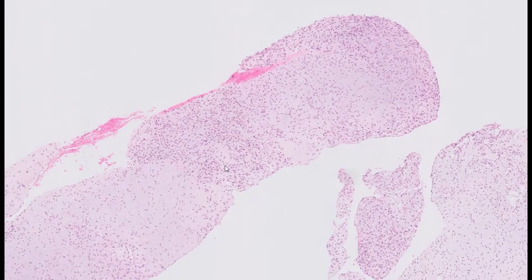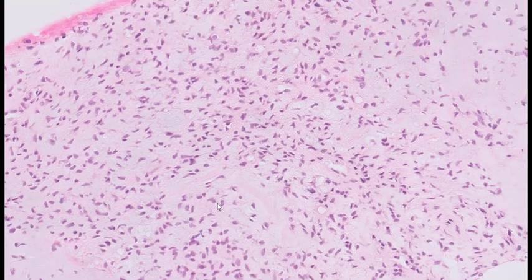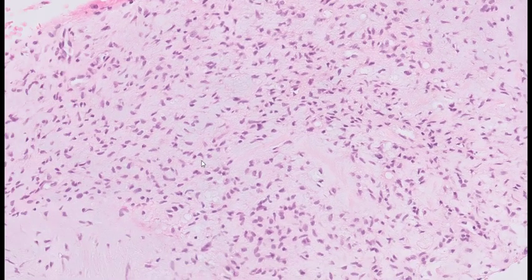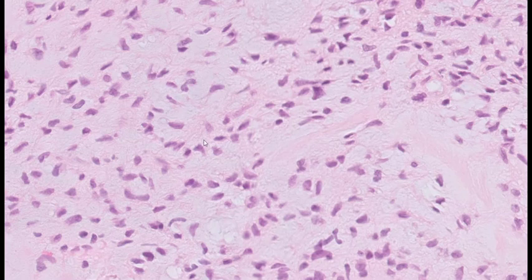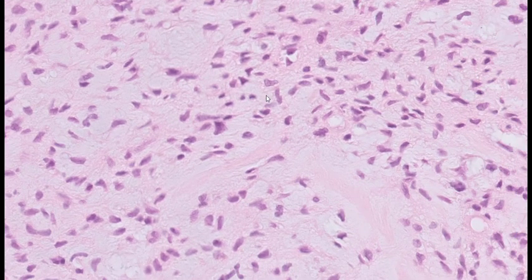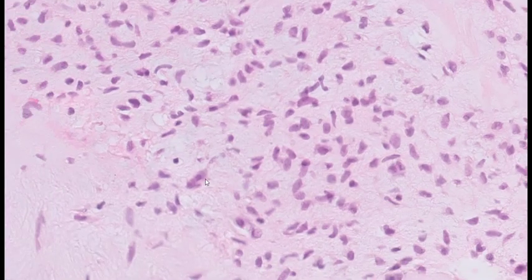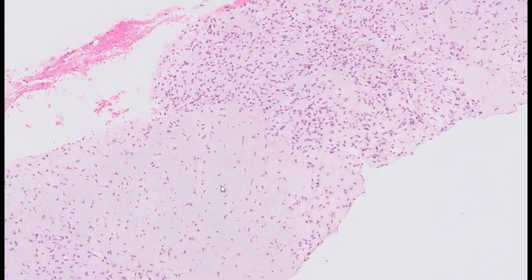Here's another look at that biopsy. And again, you'll notice that hypocellular zone divided by this more hypercellular zone, and the hypercellular zone tends to have a few additional cells making it hypercellular. None of those osteoclast type giant cells that you often see. All in all, looks like a relatively bland tumor.